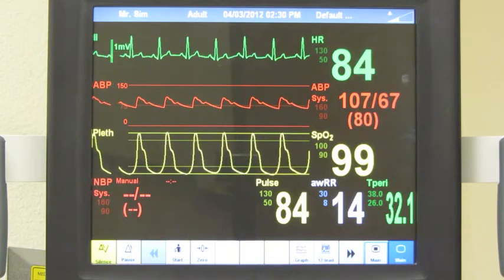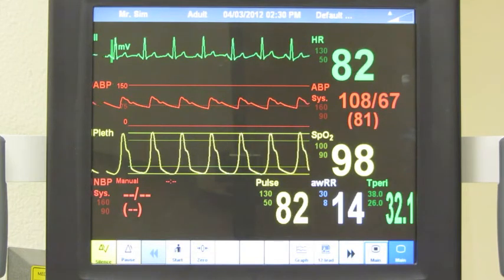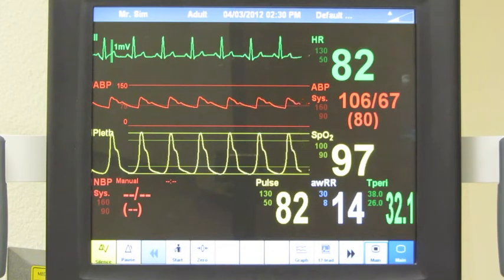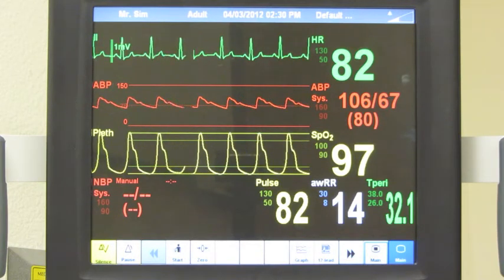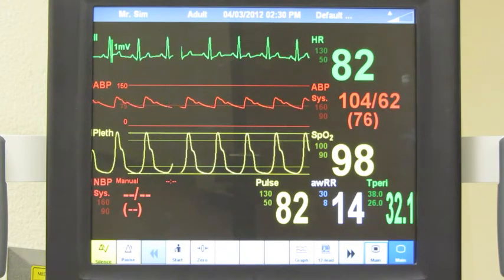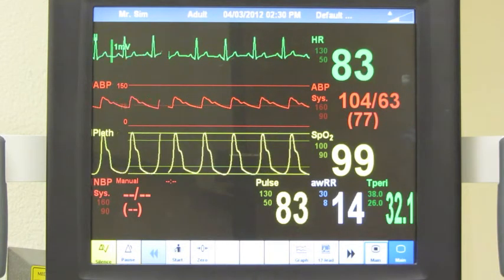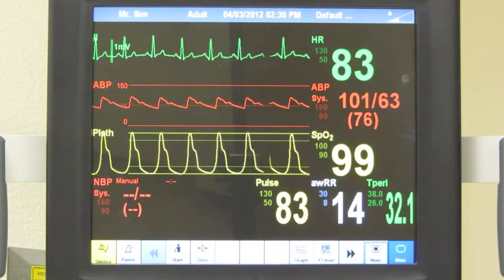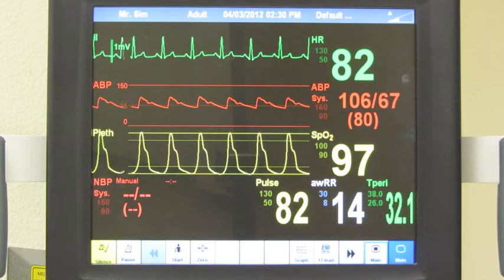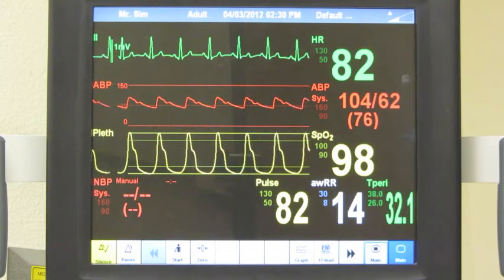In addition, you'll notice a line for blood pressure, currently set at about 108/66 millimeters of mercury pressure. Once again, both of these variables will vary slightly over the time course. That's normal variation. The third line is the oximeter reading for oxygen saturation. Currently on the screen, the machine reads 97. Please recognize the machine was set for 98 and that 97 and 99 are normal variations around the set point of 98.